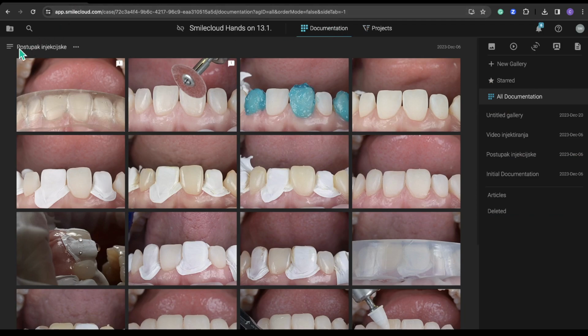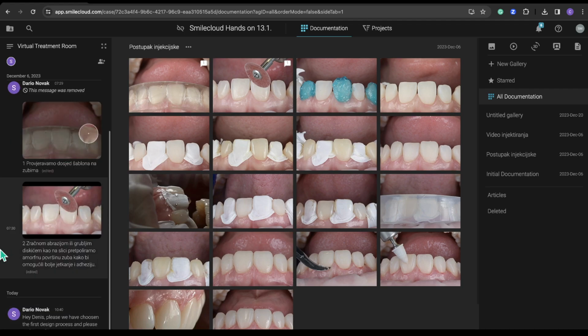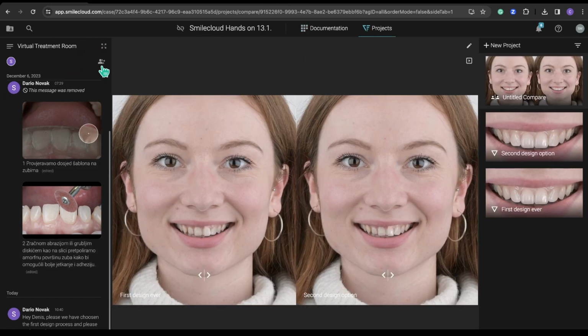Let's get back to our documentation and communication with our technician. I'm just going to write here, hey Dennis, please, we have chosen the first design process, and please make me the wax up.